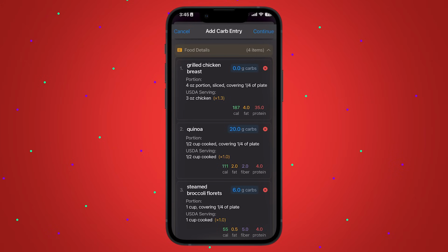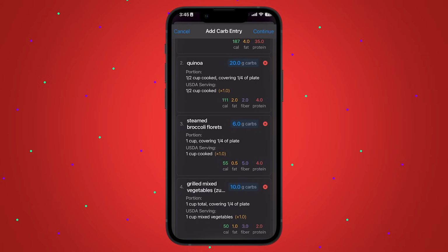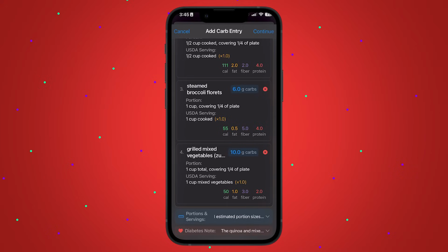And this is the thing about getting to the advanced level when you want to geek out on diabetic management. You need to know protein and fat because that impacts absorption time. That impacts how much insulin you should give and over what period of time. So it takes all of that into account. So it shows you food details. And if you have a plate of food in front of you, but you know you're not going to eat the fries, it sees the fries, but you can delete the fries and it adjusts your carb recommendation. So that's cool. So education about that.